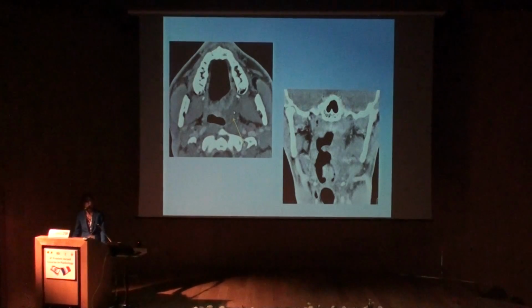And these are images of the same case where you can see that the inflammatory reaction also goes down to the pharyngeal space, and there is also haziness of the parapharyngeal fat and submandibular fat. So you look, the disease is well spread over the deep neck, and you need to find the center of the disease. And in this case, once you identify the abscess, you know this is the most central part, and then you try to find the other details.